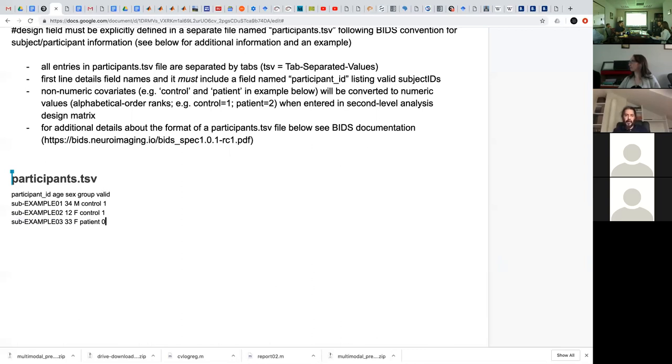If I had a case like that, I would enter NA here basically, because then when you enter valid in your analysis, it's going to remove that subject, but you still want to know what these values were for that subject in case you want to do something at some point and say, well, perhaps my bad subjects are the youngest ones, or they moved a lot, and you still want to keep these covariates. So without having to delete that value, you enter missing values in those fields.